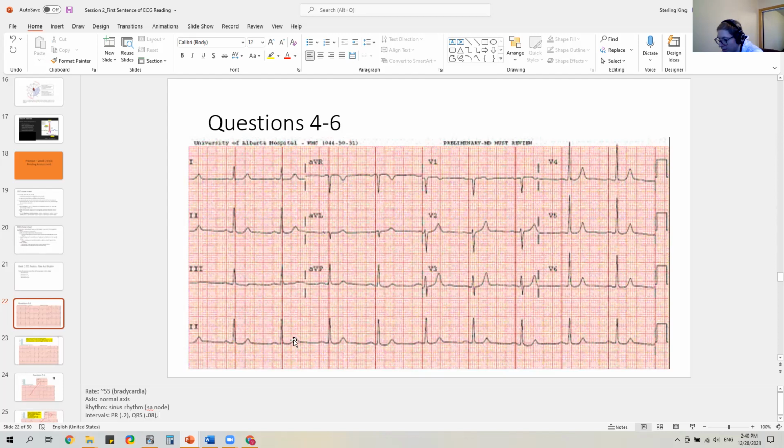So R to R, and there's my T; R to R, there's my T; R to R, there's my T. Yeah, it's less than half. So QT less than half, it's normal.